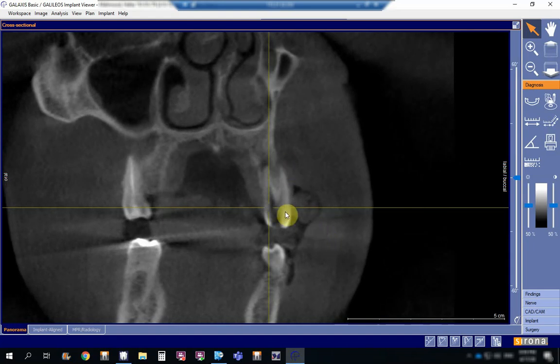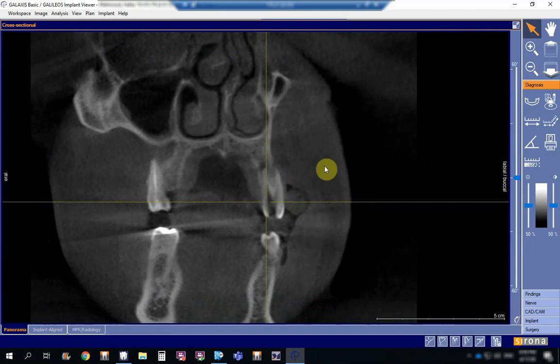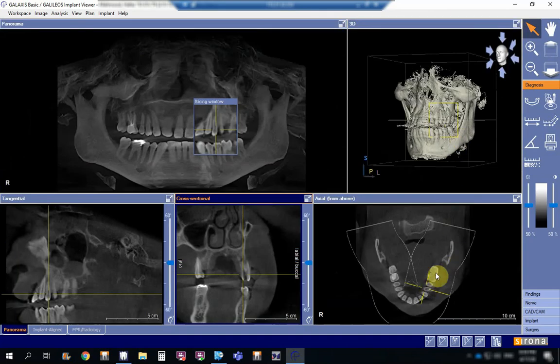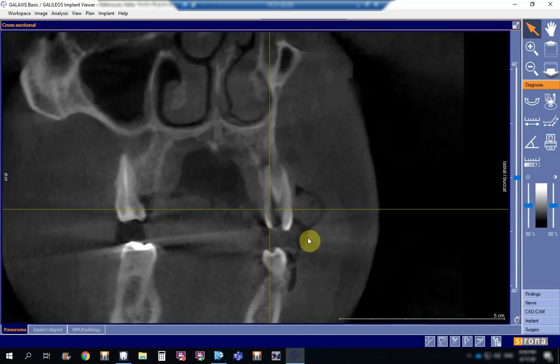In the premolar, see, this is the left side and this is the right side. How would I know? I go back to my reference. Always this letter R orients me, tells me where I am heading. So we are going actually towards the right side of the patient, as you can see in here. Let's look at the premolar.